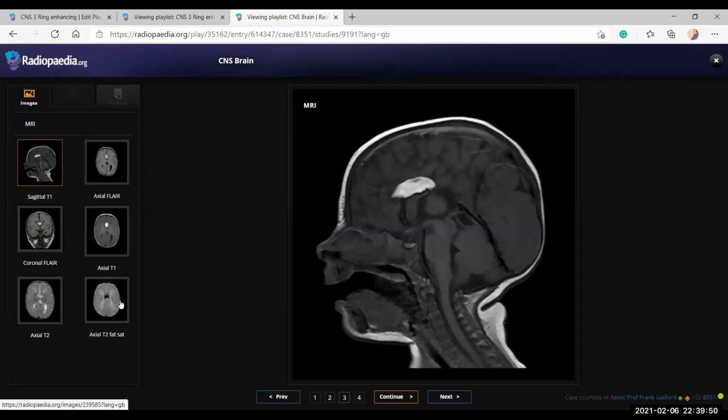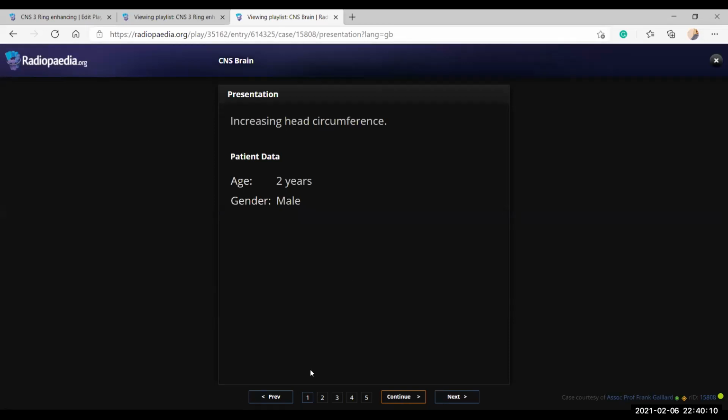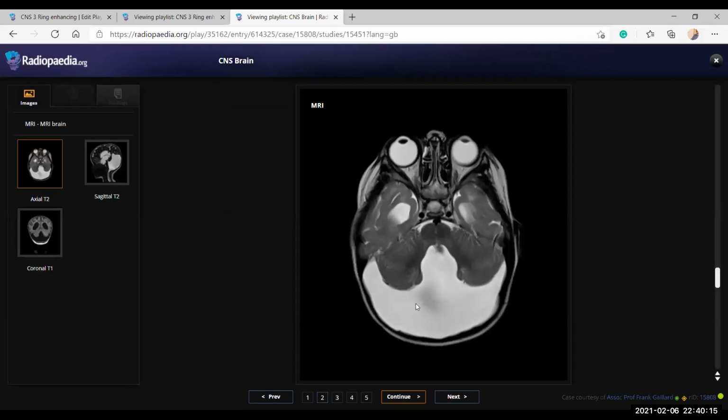And they may also ask you the types of lipoma. You correctly told there are bulky tubulonodular and curvilinear types, and usually the bulky tubulonodular is associated with corpus callosal dysgenesis. This is a good case. This is a good pickup and description, but it's a very simple case. Usually this will sometimes be the first case. They won't usually show simple ones, they will show some difficult cases. You described everything fine. When you are shown a mini case, they are checking you to see if you say all the findings.